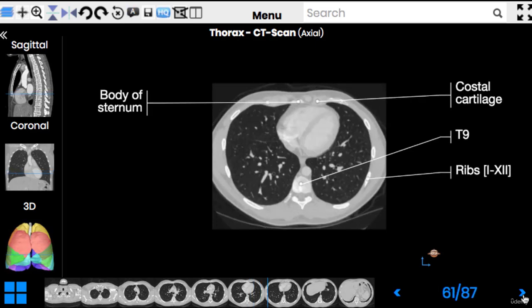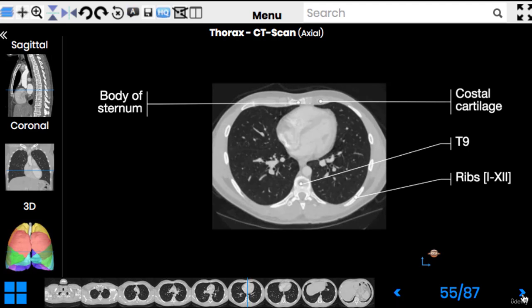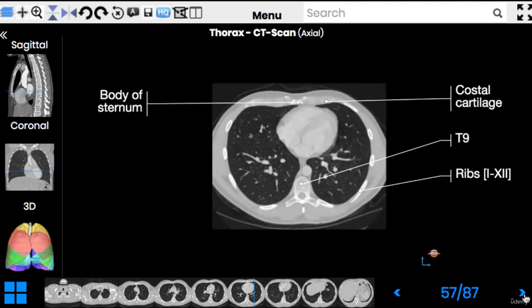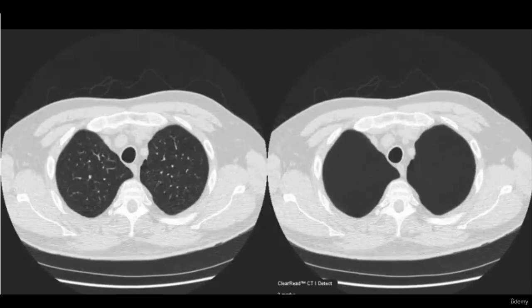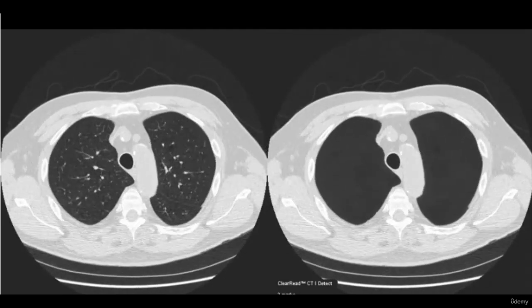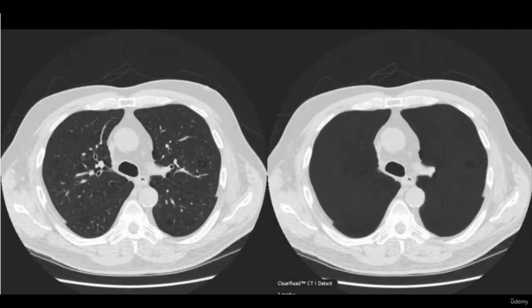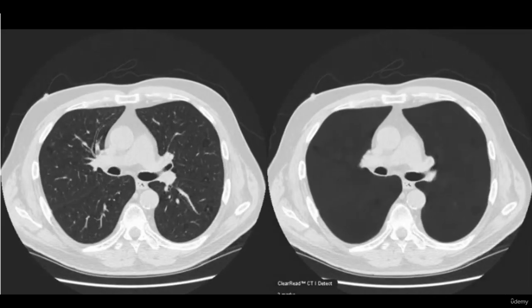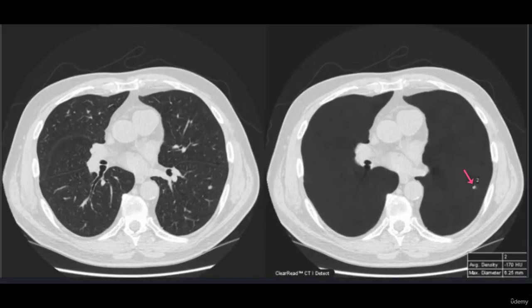If any pathological structure appears, how to differentiate the nodule from the vessel or from the bronchus? They use the special settings, the vasculature and bronchial tree suppression settings. Then vessels and bronchi just disappear from view, and only pathological nodules become visible then.